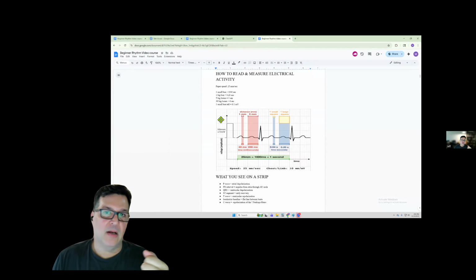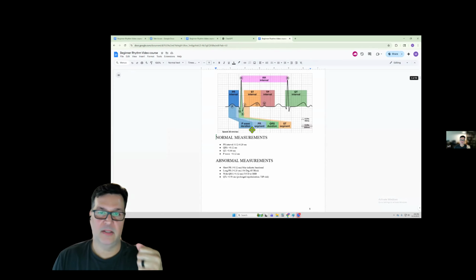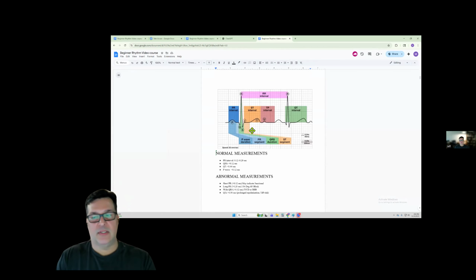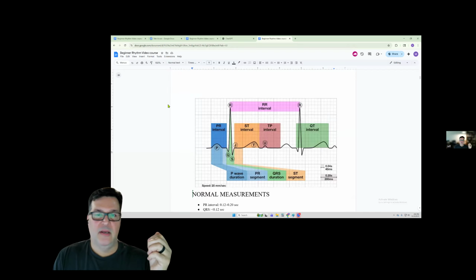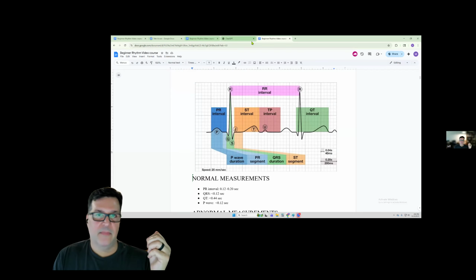With AV blocks, the problem is with the AV node, because it's an AV block. So saying that, there's nothing wrong with the SA node. That P to P is going to march out very regular onto itself. That P wave morphology is going to be consistently the same.